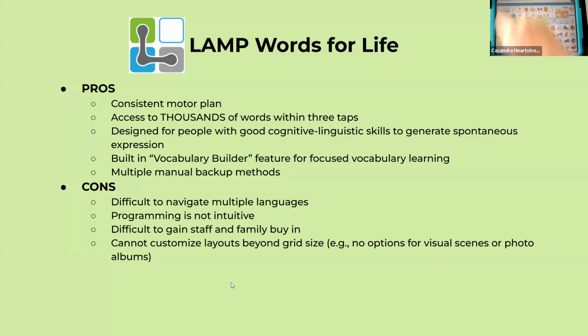One thing that I really like about it is that it has the full version, the one-hit version, and the transition version. So at first, when you first expose somebody to it, it could be the one hit, meaning this doesn't go anywhere. When you touch it, it says the word you want. Have, do, said. And then when you jump to the transition, now it just has a few versions.